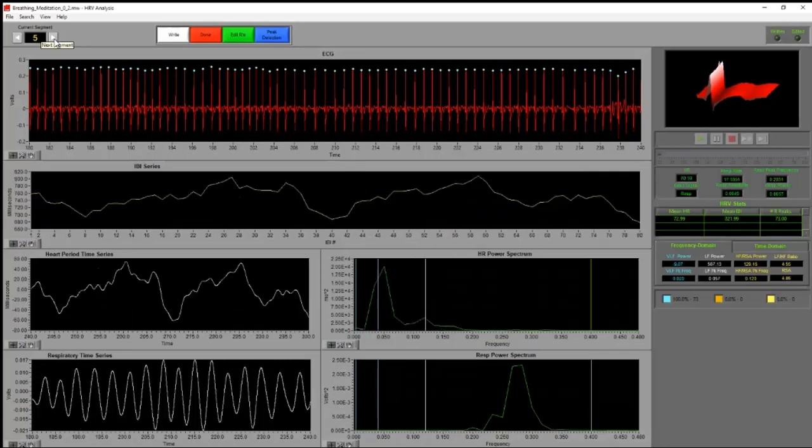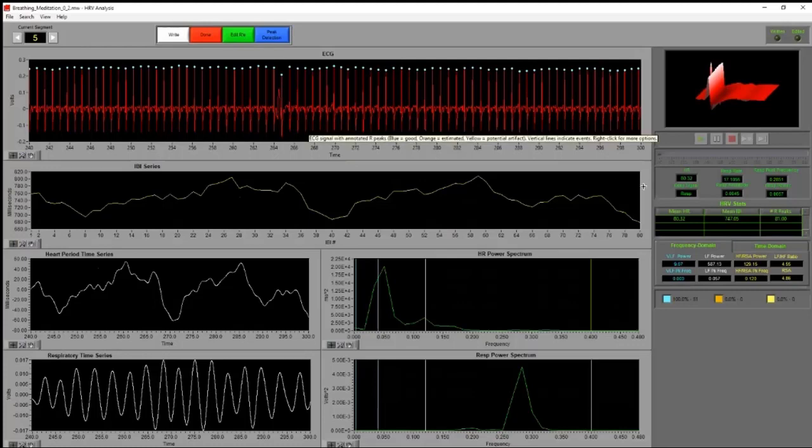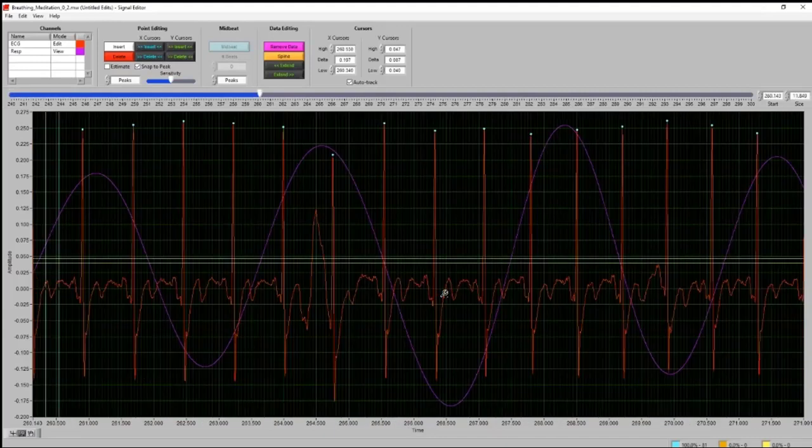Oops, sorry, still looking pretty clean. So this is a good example as well. We would certainly want to zoom in and see what that was. If you have a video of the actual acquisition, that can help out quite a bit. In this case, it just looks like probably a motion artifact would be my guess, but this looks like that P wave was distorted. Again, it's not a mandatory feature of qualifying that beat as being good. So what we do have is the QRS complex, the most important fundamental thing we need. And then it looks like we do have a T wave there as well. So this beat I'm actually going to leave alone. It looks like it was sort of a shift.